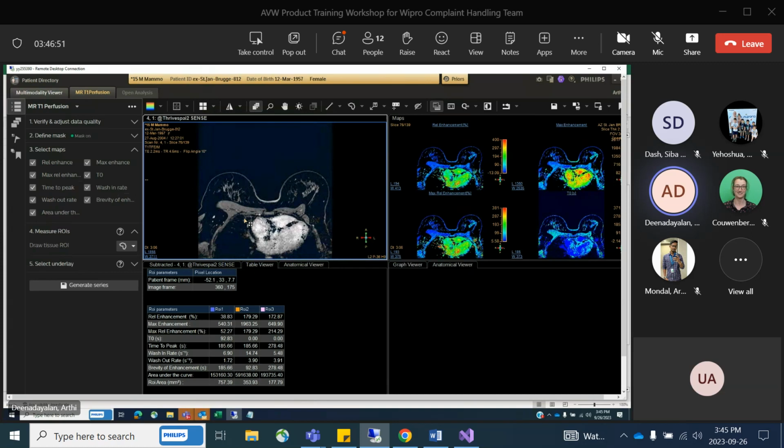One is that. Second thing is, any data sets that you load will always load on the mid plus one slice. For example, 139. Half of 139, 139 divided by 2, is approximately 70.